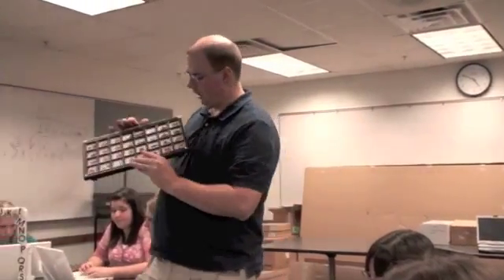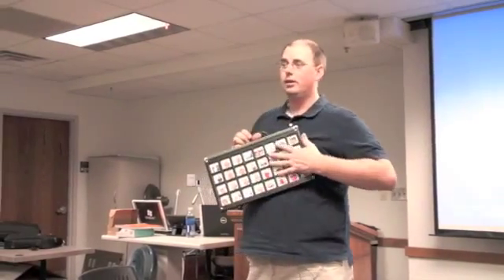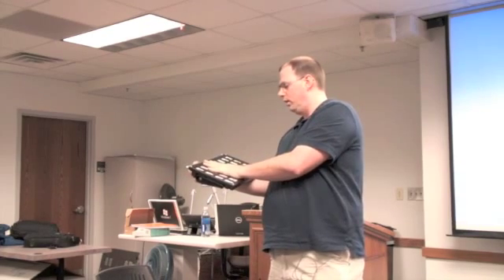Now this requires some pretty good coordination. You got to be able to hit basically a 2 by 2 inch square accurately. We've got some support though. I've got a key guard on here. So if I've got some coordination issues, like I've got a tremor or I'm hard at pushing stuff, but once I'm resting my hand on a surface, if I can move it with accuracy, and then move a specific finger, it's pretty easy to use.